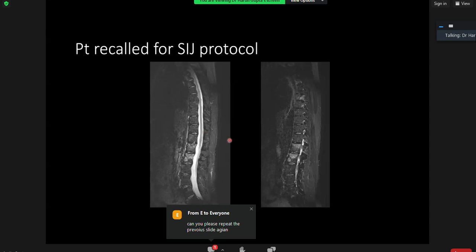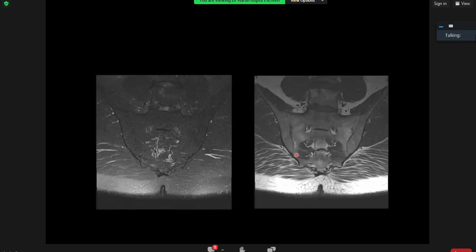And the moment the patient is brought back, we see extensive costovertebral edema, corner edema, aseptic spondylodiscitis changes. The sacroiliac joints have already fused in this patient. As I said already, the story has gone beyond the interval level. So the patient must have had these changes for years. By the time the patient presented, the SI joints had already fused, and we are now seeing active changes in the spine.